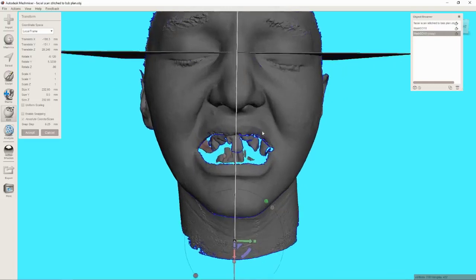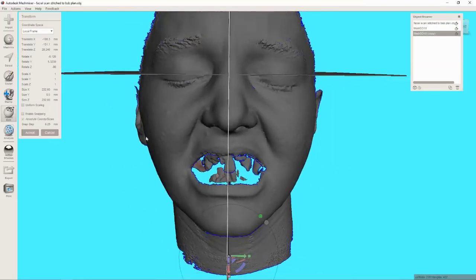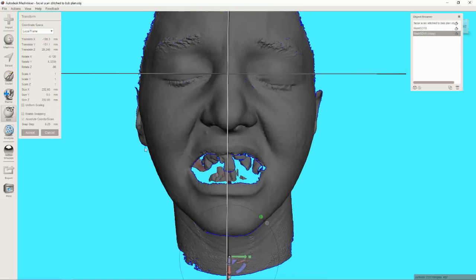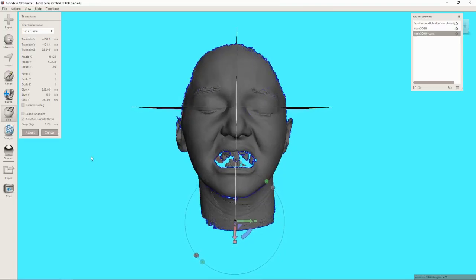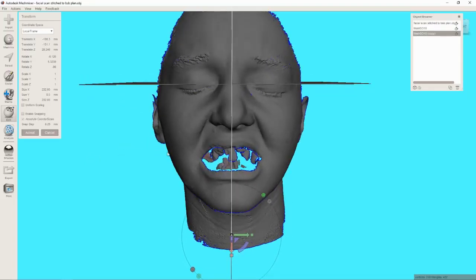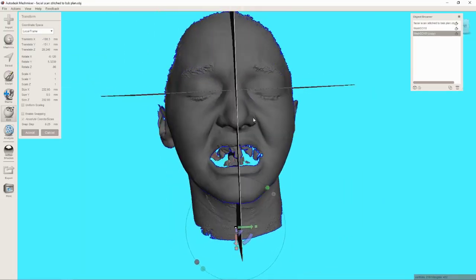Virtually everyone, you're going to see if you ever do this, even in 2D pictures, has facial asymmetry, right? It's just part of it. If facial symmetry is one of the key components of beauty, that may be why there are so few people that are truly considered absolutely beautiful, because facial symmetry is pretty rare. Most of us don't ever notice it. I've got horrible facial asymmetry. That's why I'm so ugly. But in any case, this is a facial midline.